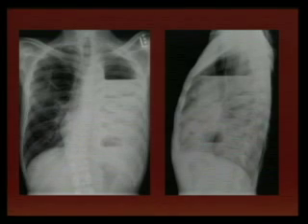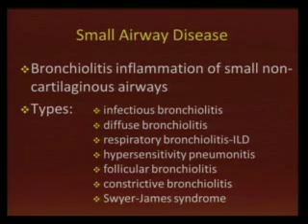About complications, we can see infectious processes within the bullae. Here we have a patient with hyperexpansion and multiple bullous changes in the upper lungs, and you can see that on the left side there are multiple air-fluid levels. That is because there was an infection of the multiple bullae in the left hemithorax.